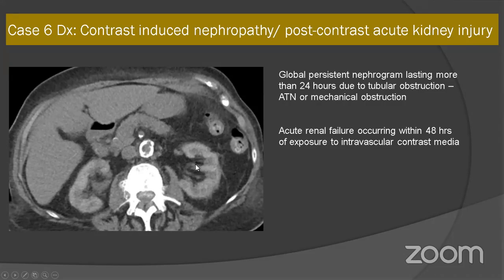This is not a case of mechanical obstruction because we don't see any dilatation of the pelvicalyceal system. And acute renal failure occurring within 48 hours of exposure to intravascular contrast media can be called post-contrast acute kidney injury. I must say that this terminology, contrast-induced nephropathy, is controversial, as there are numerous articles that mention how it is not really causative. It is more of just a weak association, and there are other contributing factors.